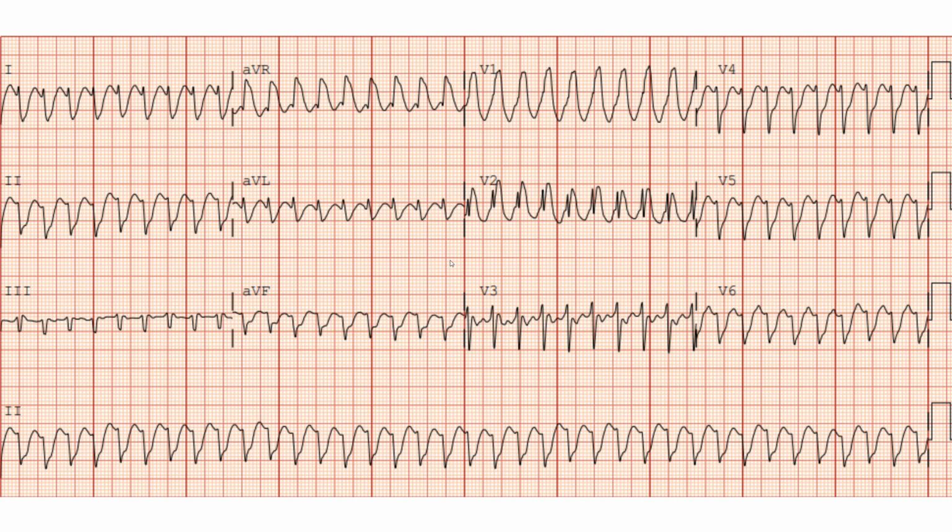The one thing here that doesn't favor ventricular tachycardia is the heart rate. I mean, this is pretty high. This is over 200. Over 200 normally isn't associated with ventricular tachycardia. I have seen cases where it's associated with fascicular ventricular tachycardia, which is pretty rare and only responds to calcium channel blockers. But that's the one thing on here that doesn't indicate VTach, the rate. The rate here points more towards an atrial arrhythmia, like either atrial flutter with 1-to-1 conduction or an SVT. So that's all the fancy nerd EKG stuff.